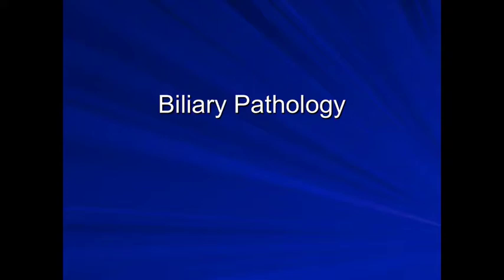Hello, I'm Adrian Gowdy, and in this lecture we're going to talk about the common biliary pathology that you may come across when performing ultrasounds.